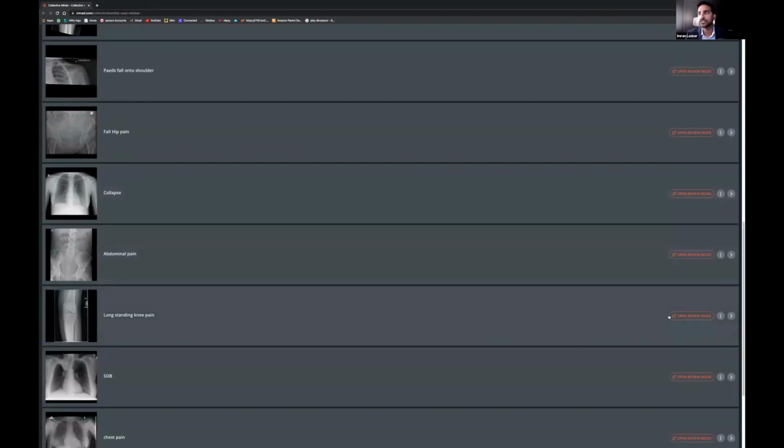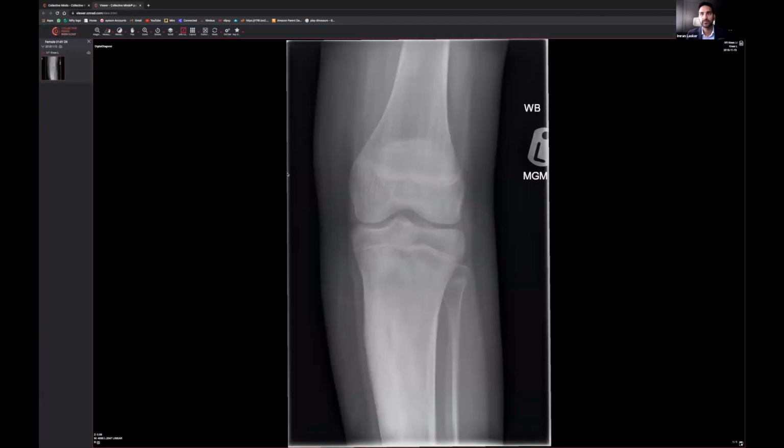Okay, so this one I think is a very, very important X-ray to look at. I think too often people are looking for fractures and they don't really notice there's something like this. Very, very important that we look at this. What you can see here is that we've got a pediatric patient. Like we said before, we've got growth plates, and you can see the growth plates are there, there, and there.